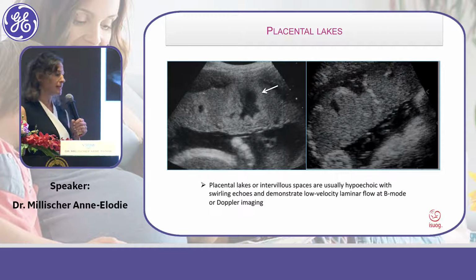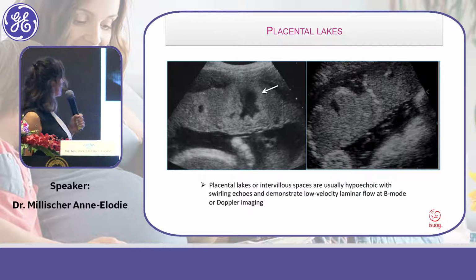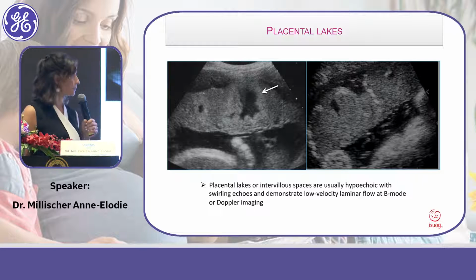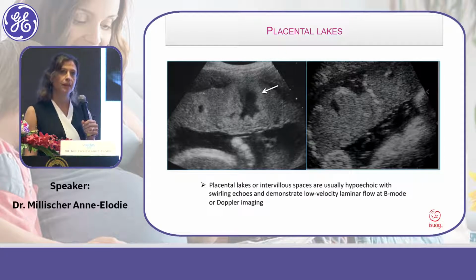Another aspect that everyone knows here is those placental lakes, which is very frequent. Và đôi khi các bạn sẽ thấy hay gặp những cái hình ảnh này trên siêu âm là có những cái vùng giảm âm, thấu âm ở trong bánh nhau, thì đây là những cái hồ huyết.